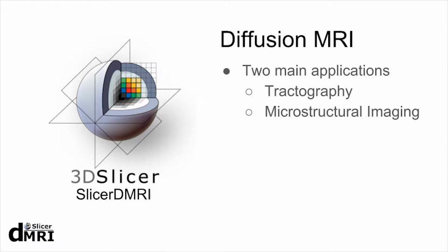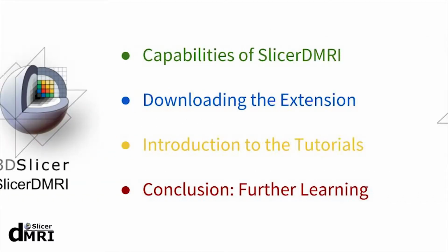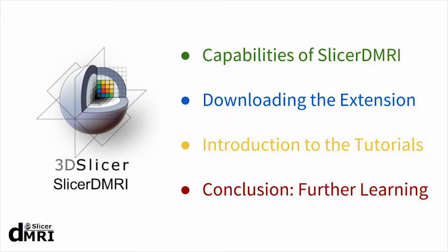This video will be an overview of some of the capabilities of Slicer DMRI, as well as display the available tutorials and resources that can help you learn all there is to know about this extension. This tutorial is aimed primarily at researchers and students just beginning to use Slicer DMRI. However, it is very likely this video will have useful information for anyone interested in Slicer DMRI and its many capabilities. Here is a list of the topics covered in this video.